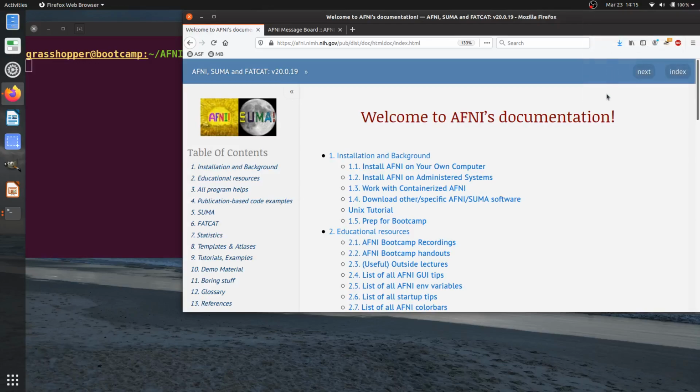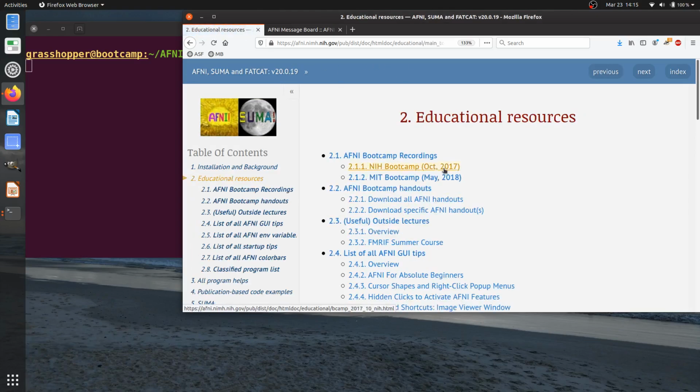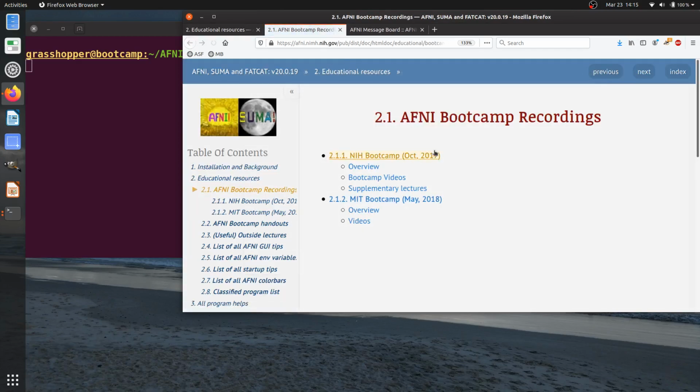Hello, in this online video we're going to look at educational resources that are available online for helping you get to know and use AFNI better. On this main page of the documentation, in this section, Educational Resources, we see the first thing that's listed are bootcamp recordings. Right now there are two sets of prior bootcamps whose videos we have online.